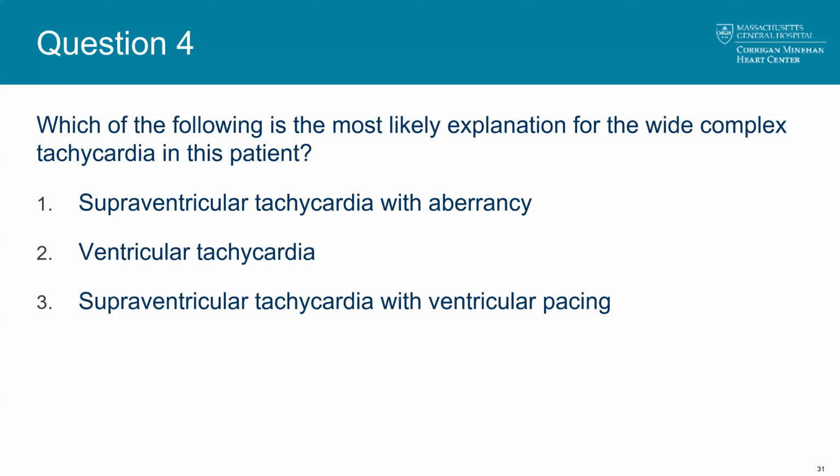So here, going to the next, thanks for being patient there. So no clear evidence that we have a supraventricular tachycardia. And is it aberrancy? Maybe, but it's tough to prove. Ventricular tachycardia, we don't have fusion beats. We don't have the Brugada criteria met.